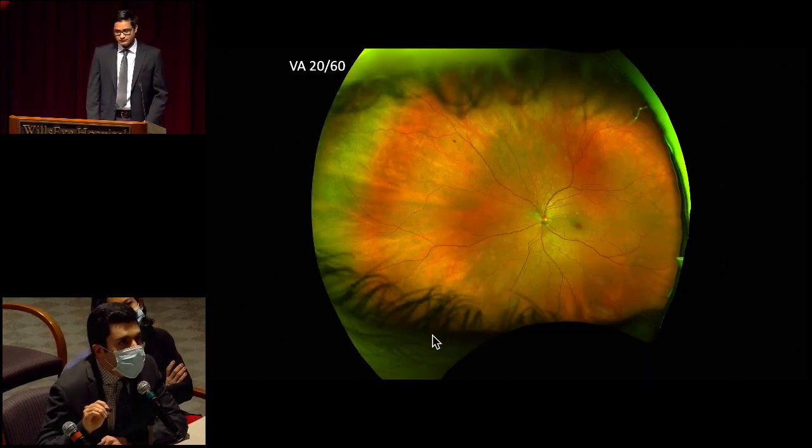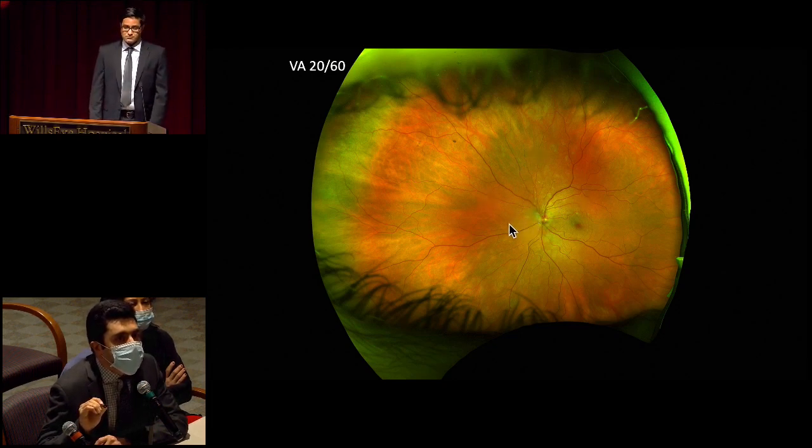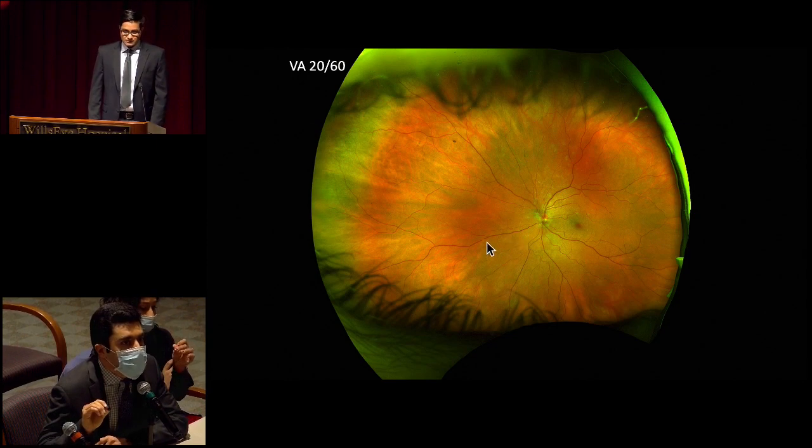So same imaging modality of the left eye. Central acuity is a little better here. The patient was less symptomatic in this eye. Media, again, is clear. The disc, once again, the inferior aspect looks a little full to me. The vasculature, also arteries and veins, appear to have a little bit of tortuosity to them. Again, we appreciate that attenuated appearance of the arteries for a young patient like this, and similar deep hypopigmented spots that we see. They seem to be less extensive, but they are localized to the posterior pole. We can see them both nasally and also temporally, a few spots in the macula.